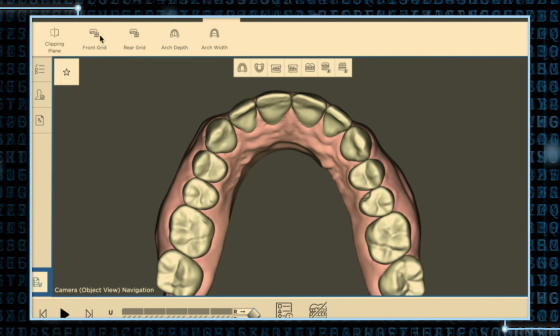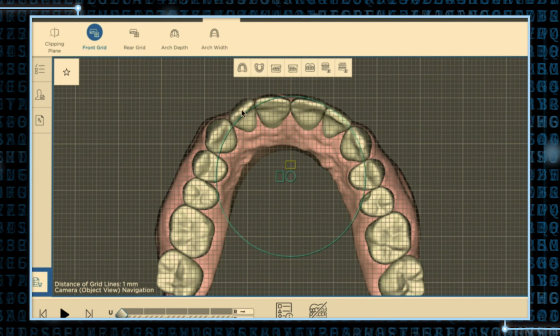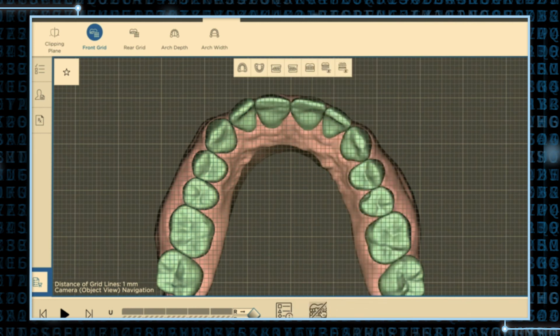And what I do when the setup comes back again is I'll usually place my grid over, and then, you can see it's a very simple case, not many aligners, I'm going to just toggle and make sure that the positions, like the midpoint of that lateral, is exactly the same. The tooth is just rotating, that's it. And then the distal points of the central stay relatively the same, but it's more of a mesiobuccal rotation. So we're not dumping those teeth forward and we're maintaining everything else. That gives us really good anterior occlusal control to make sure that we've got the right amount of overjet.